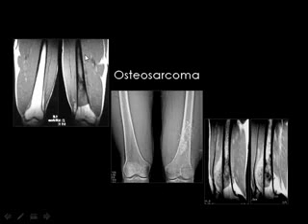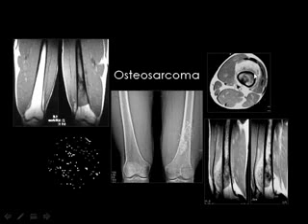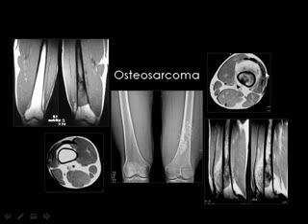And this is an osteosarcoma, and you should have the opposite side for comparison. This tumor extends in this area, and this is the plain X-ray of the diseased limb and the sound limb, and this is after contrast enhancement. And I usually say that the diagnosis of bone tumors is better before contrast injection rather than after contrast injection. Then here you can see the extraosseous soft tissue component, which is enhanced, almost similar to the fat. But if you have the non-contrast image, you see this tumor in a good way rather than this one.